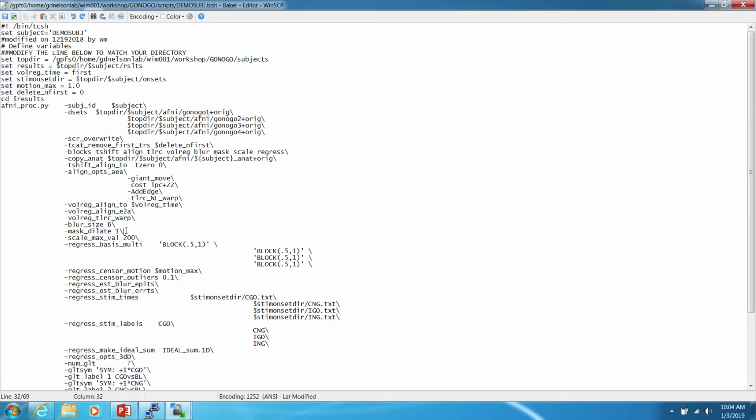That might be particularly good for somebody who's got a tumor or a resection or something, which we deal with. You have a whole bunch of different options of ways you can mask in the program. This is actually the default that it does, and so we don't apply any of the masks in our analysis. There's a bunch of explanation of that, but basically we don't really need the mask. But we make it anyway in case it becomes important later.